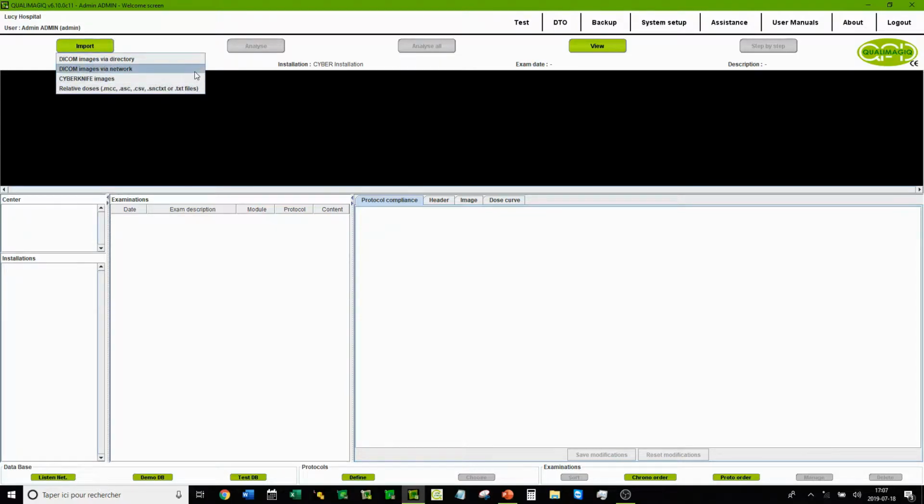I will begin by showing you the CK Pilot module, which operates the acquisition of the BEAM images using our portable MV Portal Imager. For this, I will select the third option.